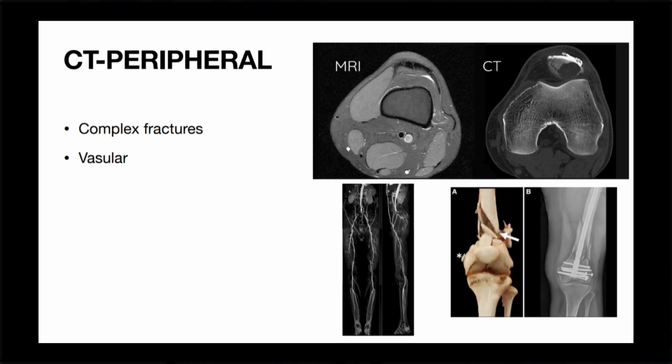But if you have conditions which involve the soft tissues, like for example here we're measuring the cartilaginous cap of osteochondroma, you need a T2 MRI, and of course here when you're talking about meniscal tears, tendon tears, you're talking about bone marrow edema, again MRI is superior than CT. So in trauma, in a nutshell, you may end up using both of them. The CT scan to define the bone fractures more clearer, and the MRI comes in with a definition of the soft tissues.